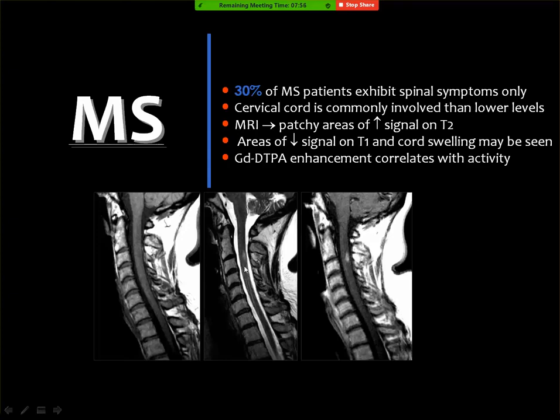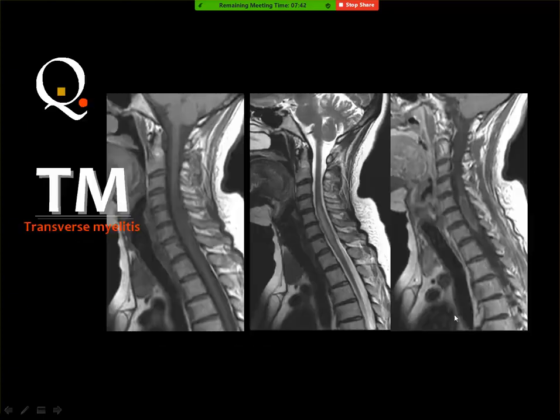Okay. And intramedullary lesion for differential diagnosis, not this, the previous one, the question. Yes, MS is an intramedullary lesion, actually. No, doctor, about transverse myelitis, yes. The diagnosis of transverse myelitis. Yes, you should say, for comment, this is an intramedullary abnormal signal extending from so, and it shows low signal in the T1 and the bright signal in the T2 weighted image. And for differential diagnosis? Yes.